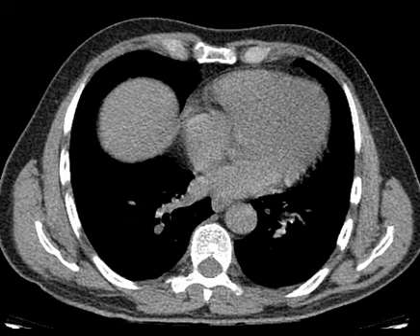So this patient presented to ER with extreme tenderness in the right hypochondrium, and doctors were thinking about acute cholecystitis or cholelithiasis. They ordered an ultrasound. On ultrasound, there were no gallstones, no cholecystitis, and the patient was referred for CT scan. So we have this history of extreme tenderness in the right hypochondrium.